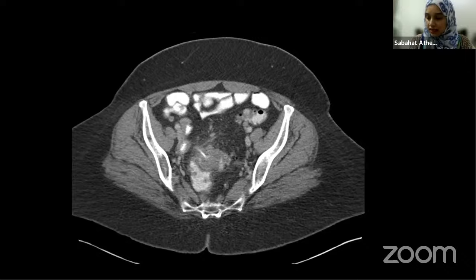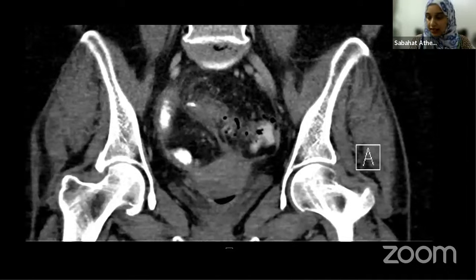It is subtle, but once you see it, you will be, yeah, complicated diverticulitis. Okay, we did not have any collection, but okay, I'll take it. No, it's excellent. Somebody said IUCD, but no, this was not IUCD. There was no abscess. Yes, wall thickening was there. I agree. Fistulous communication. With what?